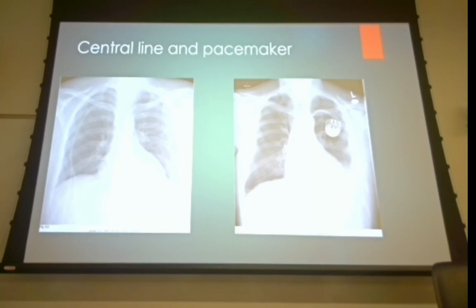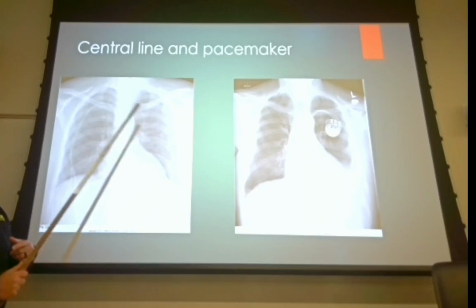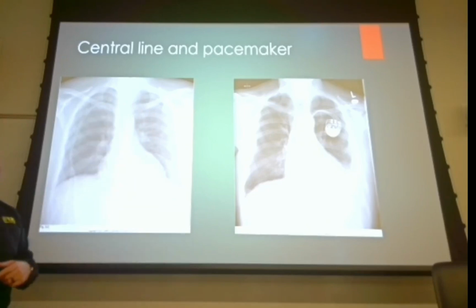So most of your docs are going to probably readjust this to try to get it going in the proper direction. If it's a hard enough stick, I've seen docs say, it's good enough. I can dig around in there all day and nothing's going to change. That is not a problem whenever they do a jugular stick, but if they're doing a subclavian, sometimes it becomes a problem. Okay, so there's that.